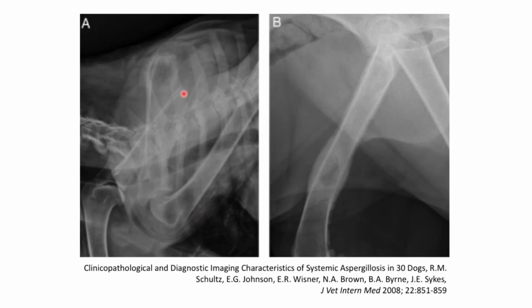And we can see them affecting the scapula, and also the humerus, and also the femur. And these lesions have all the characteristics that we'd expect from aggressive bone disease. So there is evidence of lysis, cortical destruction, a periosteal reaction, and also a fairly indistinct zone of transition, particularly affecting this lesion present on the scapula.